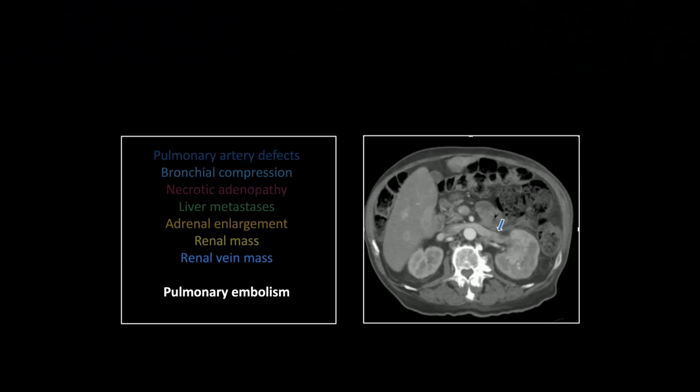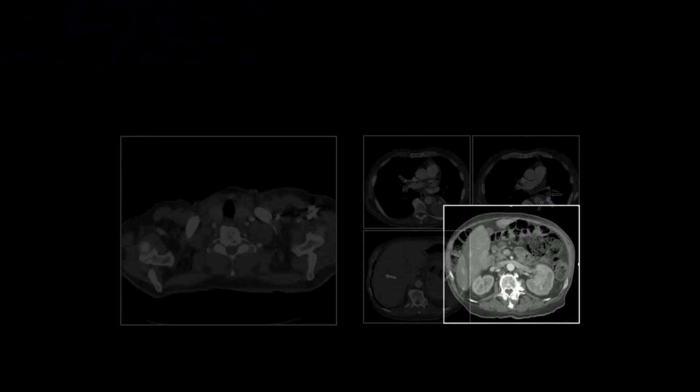the adjacent vessels. And it's really important that you note the enhancement pattern. As one of my old attendings used to say, that right there is a piece of beefsteak. It's sometimes hard to tell bland thrombus from actual tumor mass, but that is actual enhancing tumor mass. And you can see it is both more heterogeneous and slightly more enhancing than the normal blood that's present in the left renal vein there. So of course, this patient is at risk for PE, and this is something you'll see, right? An angioinvasive renal cell carcinoma presenting initially with pulmonary embolism.